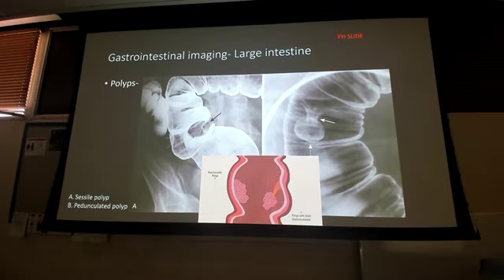These are what polyps look like. Do not memorize sessile or pedunculated. I'm just showing you. Notice how the polyp is on the inside of the intestines. The polyp is going on the inside. All of my diverticuli are out pouches. This is inside. Okay? This is what they'll find on colonoscopies.